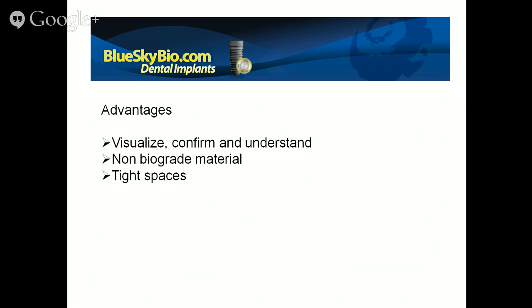But right now, you could get a printer that prints non-FDA approved material. You could print the model with the post. Because none of that material is going into the patient's mouth, there's no problem with it. You'll then do a vacuum press or suck down on top of it with the metal cylinder. We'll take a look at that. And you can make your surgical guide.